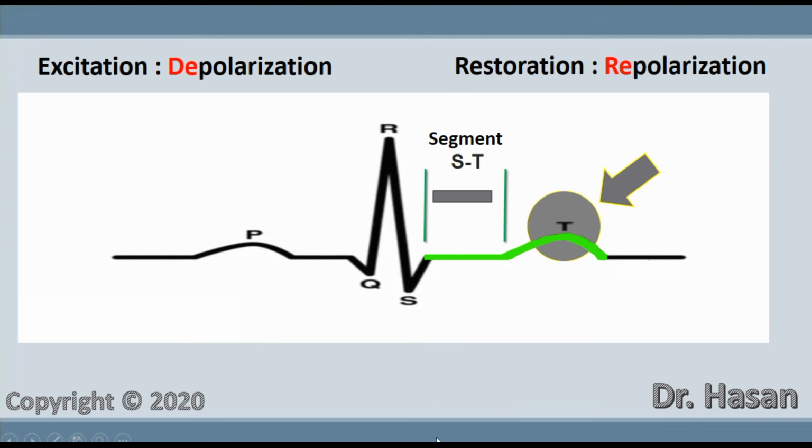This means that after depolarization, a smooth transition to repolarization occurs. These two processes are superimposed on top of each other. This means that there is still excitation, but recovery is already beginning. And when their total work is equal to zero, an isoline in the form of the ST segment will be recorded on the ECG. But the T wave is already the repolarization of the ventricles. In the myocardium, the process of repolarization over depolarization began to significantly prevail.